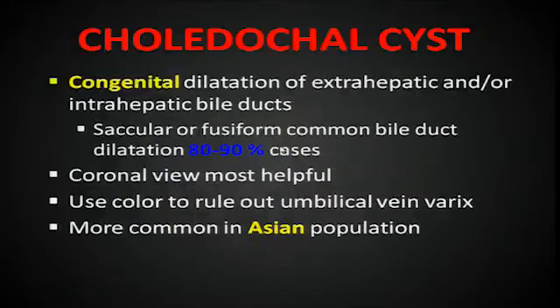Choledochal cyst. Congenital dilatation of the extrahepatic and/or intrahepatic bile ducts. It's usually saccular or fusiform, with common bile duct dilatation in about 80 to 90% of the cases. Coronal view is the most helpful.